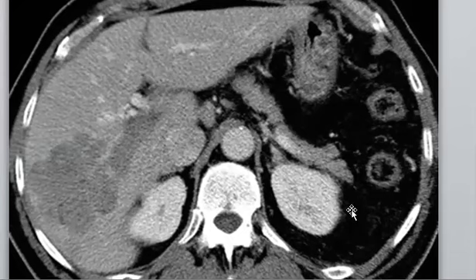And search for other criteria of cirrhosis. As we mentioned, you will see the ascites, and whether this patient has splenomegaly and portal hypertension. Yes, perfect. Signs of cirrhosis, I agree with you that maybe it is not very typical here.